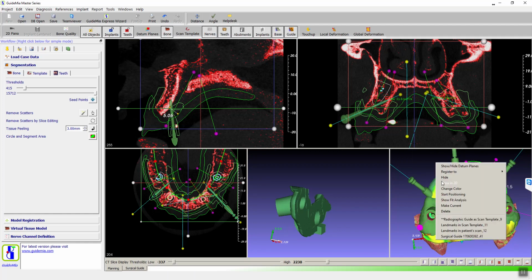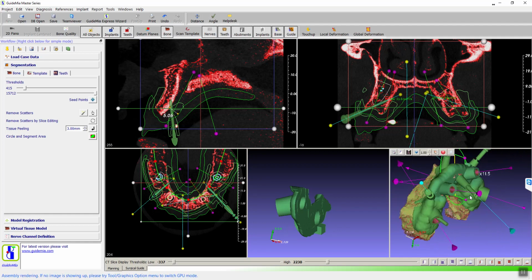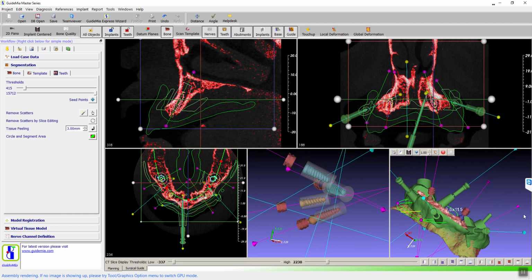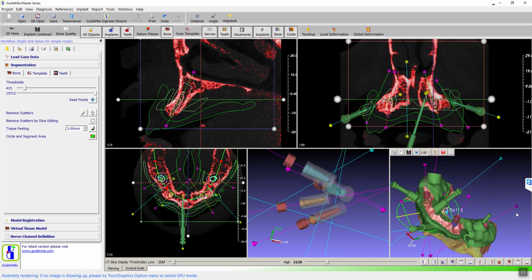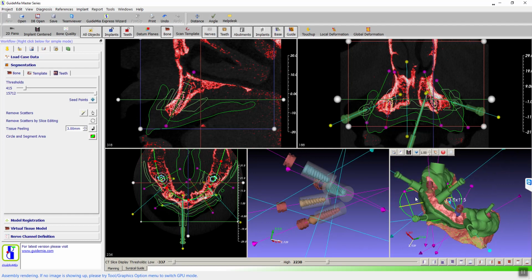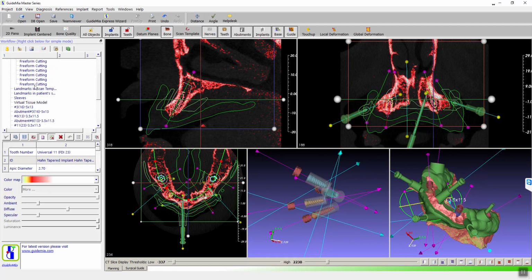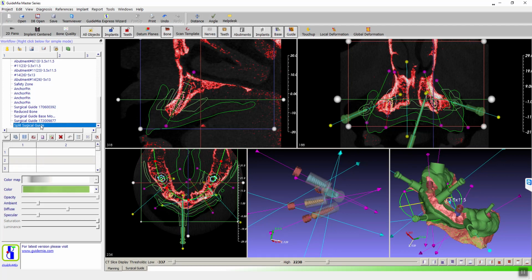Hide this one too. Which one is supposed to clip in? You say it clicks in, but the one that I printed from you earlier, there's no clicking going on. Meaning it doesn't go in. Well, no, it was misaligned and it didn't stick. It comes off really, really easy. Yeah.